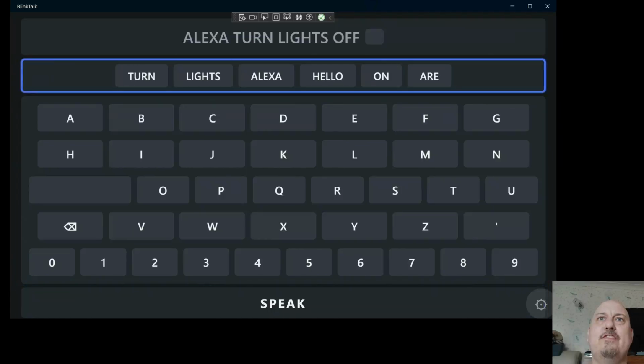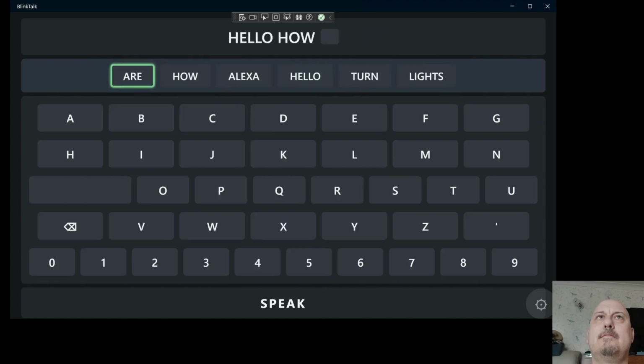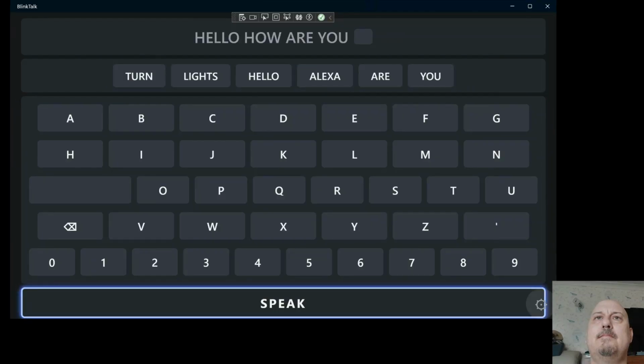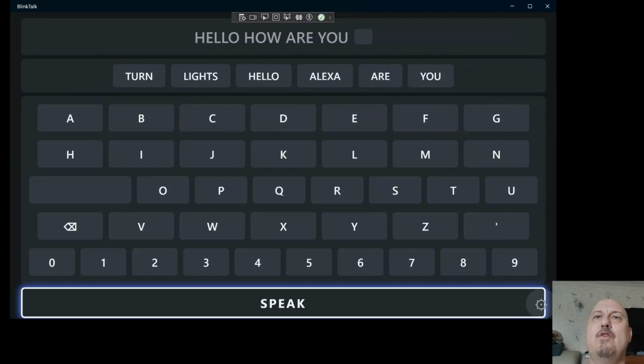So let's say someone else comes to greet me again. As you can see, this is now becoming very fast because I've used it for about 15 minutes. Hello, how are you? And it's learning me just within 15 minutes. It's learning the kinds of things I like to say, and it just becomes a question of looking up at the right time to form long sentences.